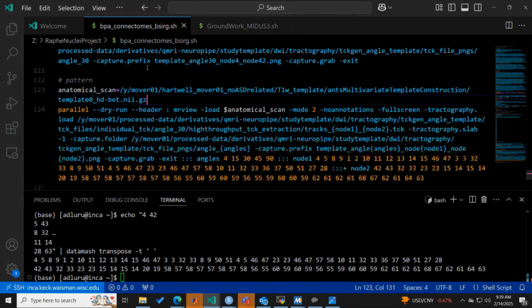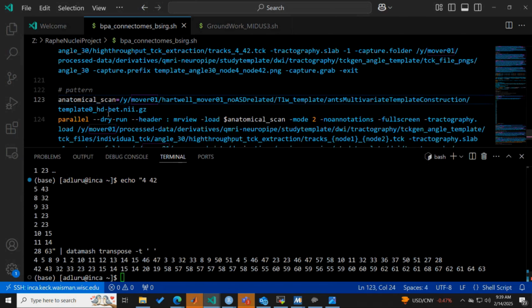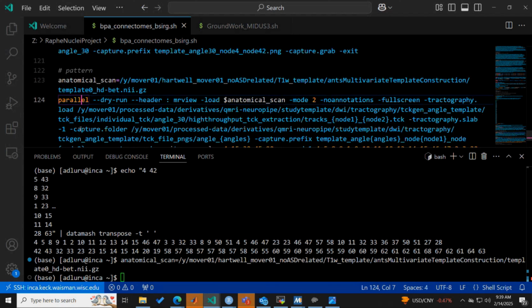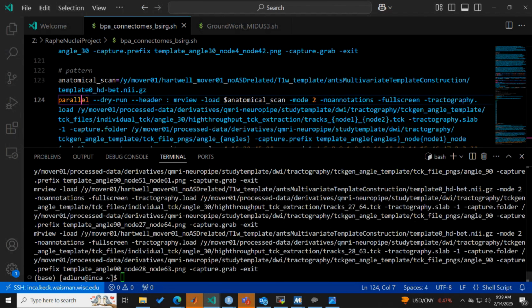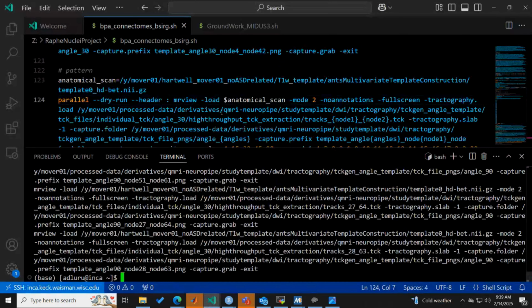I mean, this should work. Oh, you do need to make it to study, or wherever you're going to place it on your Mac. Yeah. This is a dry run, so we should be fine. You see? Oh, it's quick. It's going to run all of these, and then you see how it creates these. One annoying thing that I still left off, which you'll probably figure out, is the 000, but I'm sure you'll figure that out. I just don't remember. But that's it. Perfect.